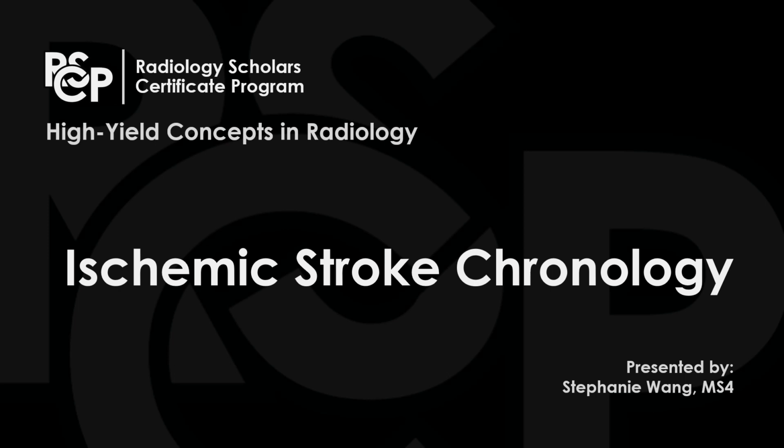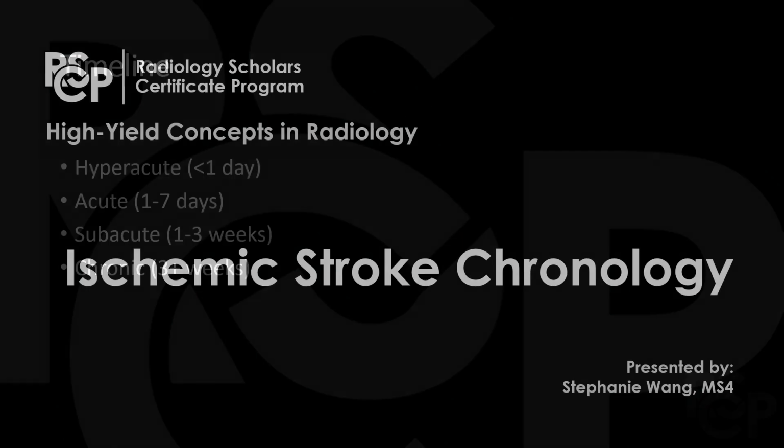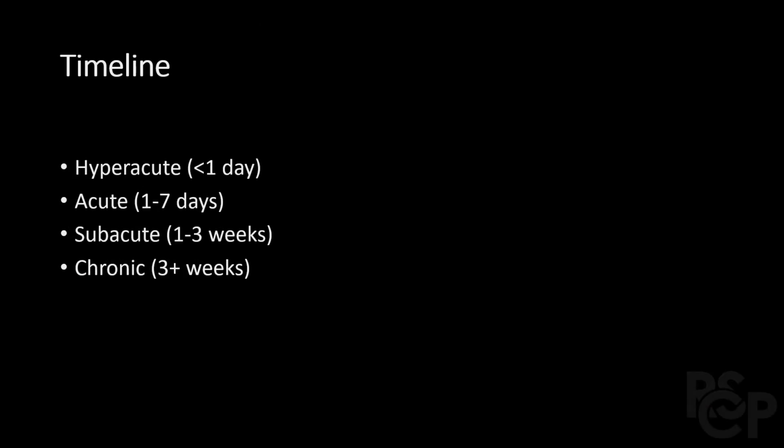This video will focus on the evolution of ischemic strokes, also known as infarcts. As a stroke evolves over time, its appearance on imaging will change. This timeline can be broken down into 4 phases.